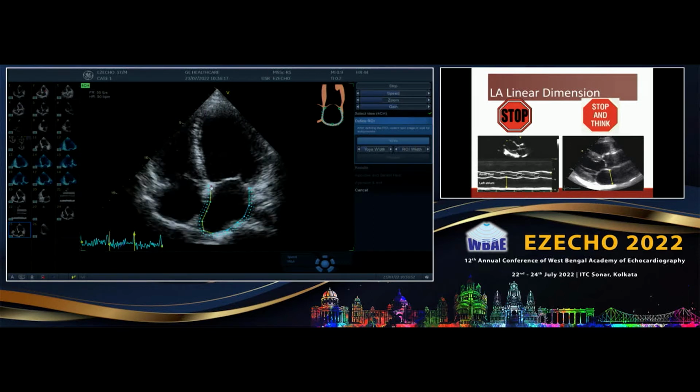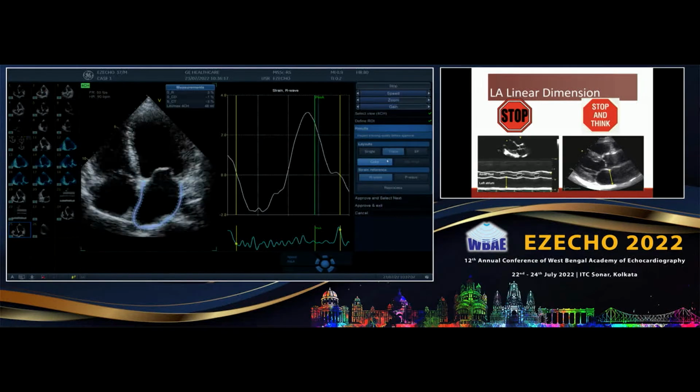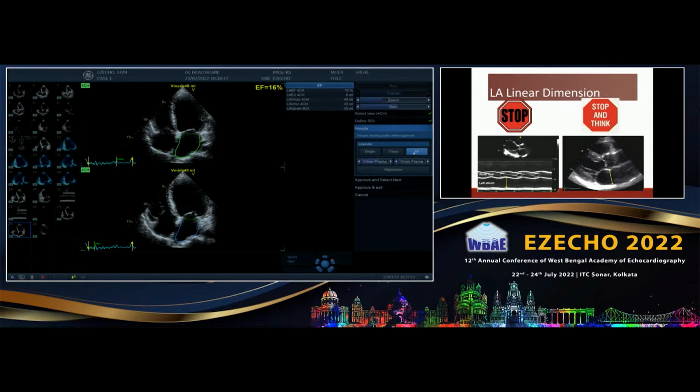Right, LA volume. Quickly to the LA volume. It's very important nowadays to diagnose the diastolic function, HFpEF, whatever may be. The LA volume is now a must in every routine clinical examination, because it is one of the 4 robust parameters of determining diastolic dysfunction. So always remember, when you want to take an LA volume, LA should be in its long axis.